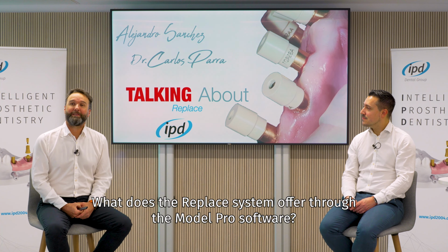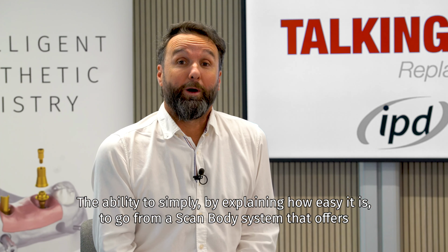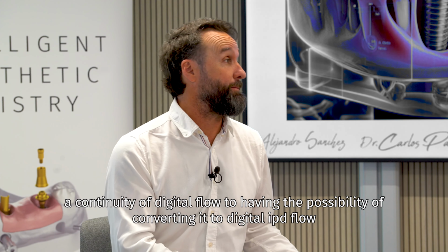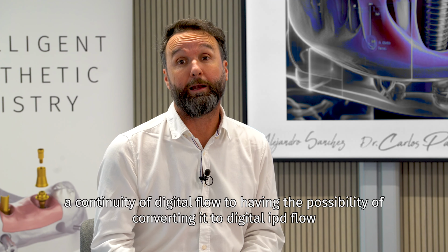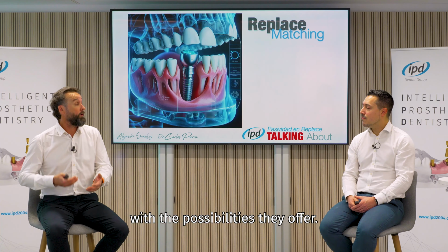What does the replace system offer through the Model Pro software? The ability to simply, by explaining how easy it is to go from a scan body system that offers a continuity of digital flow to having the possibility of converting it to digital IPD flow with the possibilities they offer.